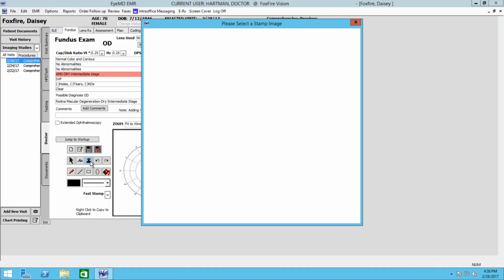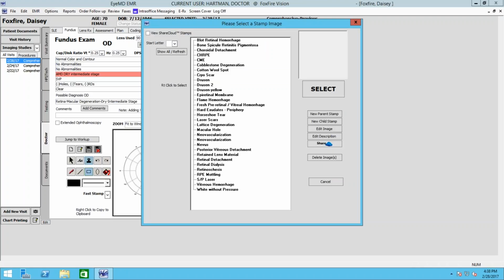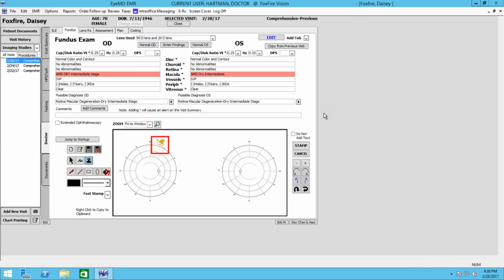Okay, good. And you have the two again? Yeah, you want to choose them, then click that. Okay, select. Click. Okay, now put it where you want it on this eye. Click it. Yeah, and then go over this one and click it where it is on that eye.